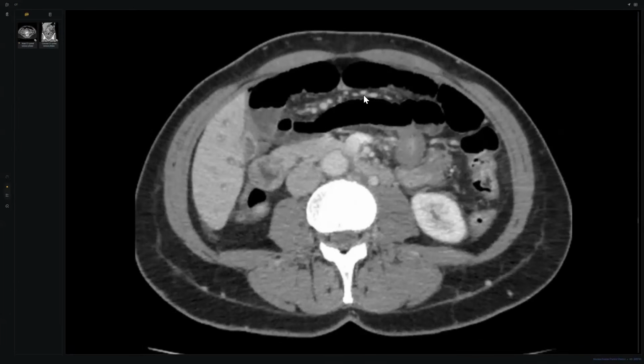Yes, what is the association? They increase the pressure, they inflate air, it made the bowel loop herniate through the foramen. So any laparoscopic surgery is highly predisposing for internal hernia. Very common, my colleagues. The discussion will be like this in the exam, and you must give explanations about what you are seeing in the exam.